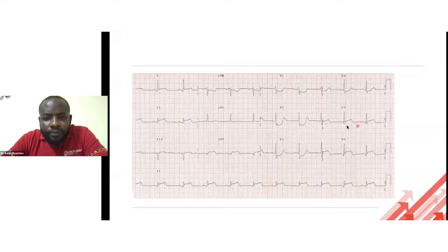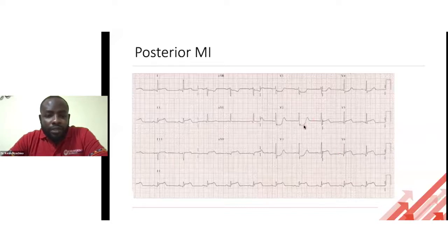V5, okay, I agree. But significantly, what are we seeing here? V1, V2, V3, sometimes in V4. Okay. Remember, when you're placing ECG leads, from the way the orientation is, they are reading the orientation of the heart front to back. So this is a posterior myocardial infarction.